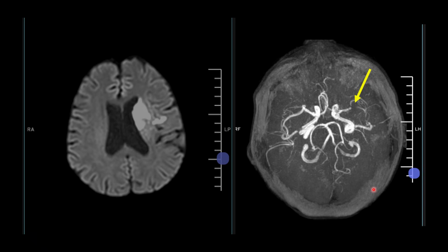present. But the problem is this was the same appearance in diffusion weighted imaging in this patient, which was done at around 6 hours before. That is, even after 6 hours, when the diffusion weighted imaging was repeated, there was no progression of stroke. This is very important. Outside they had done an MRI in which we saw it was similar areas.